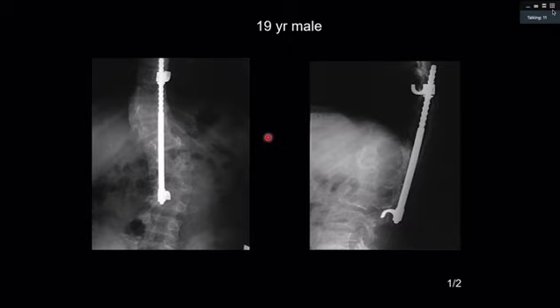On the lateral radiographs, we can see posterior vertebral body scalloping with enlargement of the neural canal, and likely secondary degenerative changes to the abnormal alignment of the vertebral bodies.